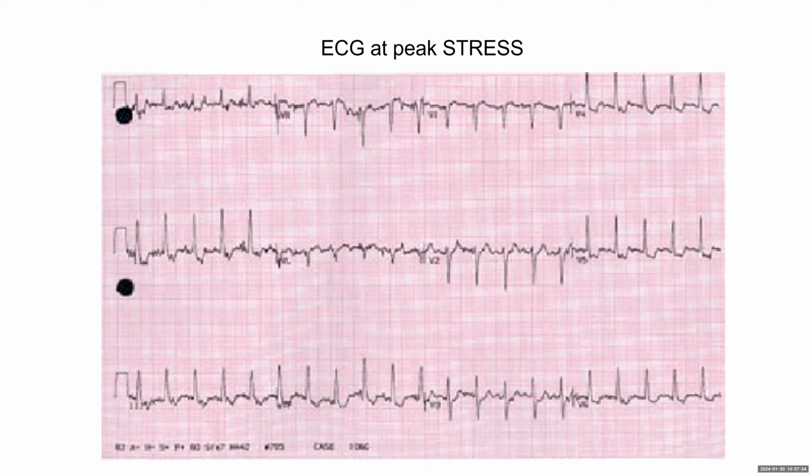Yeah, so always try to just describe, because if this was only a stress ECG, I would say it's great to say this is high risk, let's move on. But because you still have another component. So I agree with you. There is a downsloping ST segment depression. Number two, try to avoid localization if it's not ST elevation. But you can mention the leads.